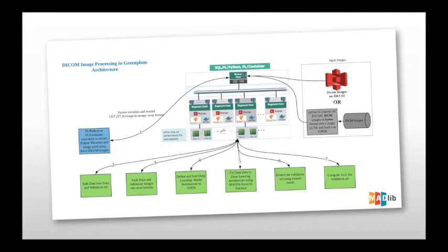So we have patients' images with pneumonia and patients' images without pneumonia, and you train on both of them. Then the validation set will have 221 images which the model doesn't see, and it will be able to tell whether the patient has pneumonia or not based on the DICOM image. So that's the sixth step.